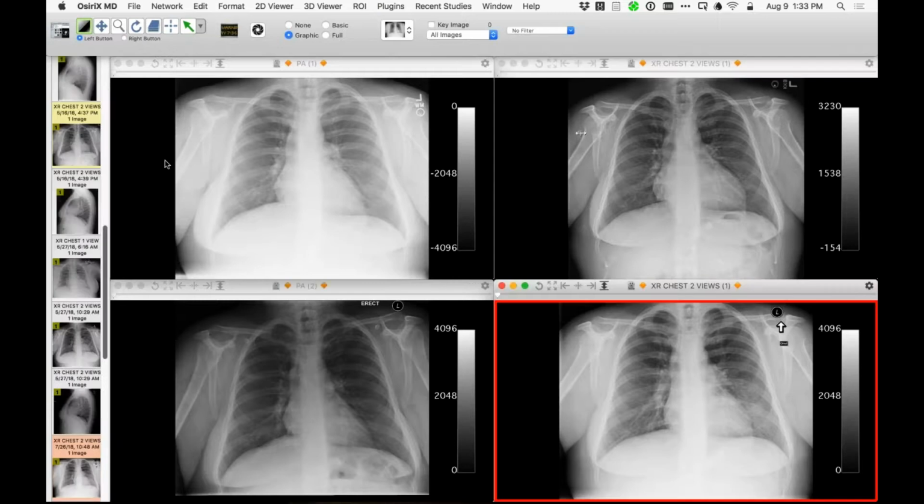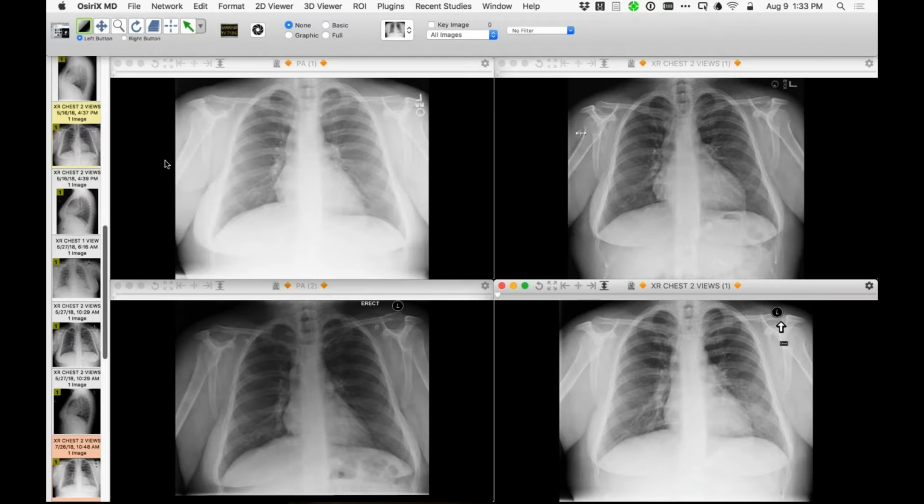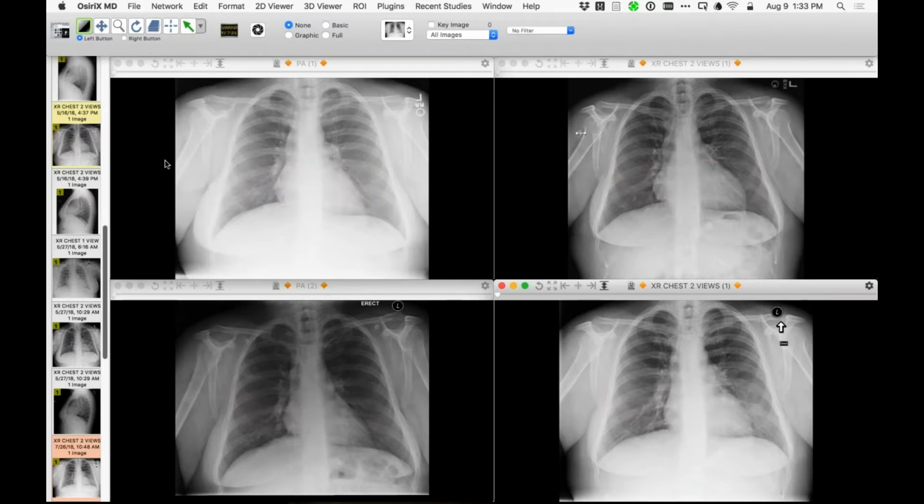Okay, here is another case which is really interesting. So I'm intentionally showing you 4 radiographs, and I'm going to show you the timing here. 2011, 12, there was some in between, but I'm going to show you representative images from earlier this year. And I'm going to tell you that there are some findings on these that are subtle, but they're all the same. And they're pretty much present to one degree on all of them, but not appreciated, not reported. So I'm going to just bring them up in turn.